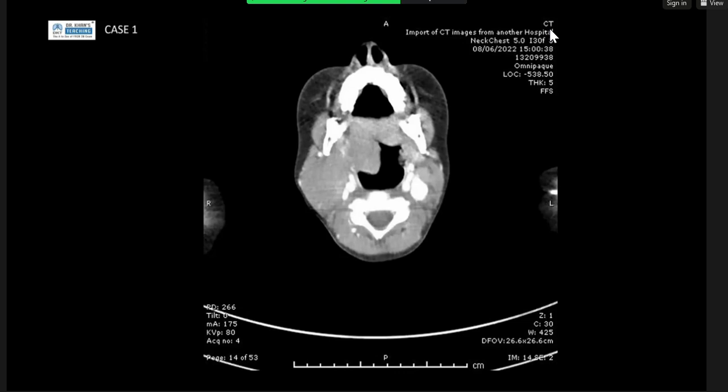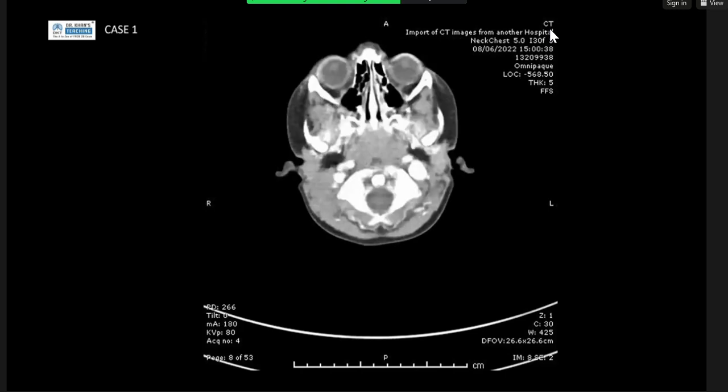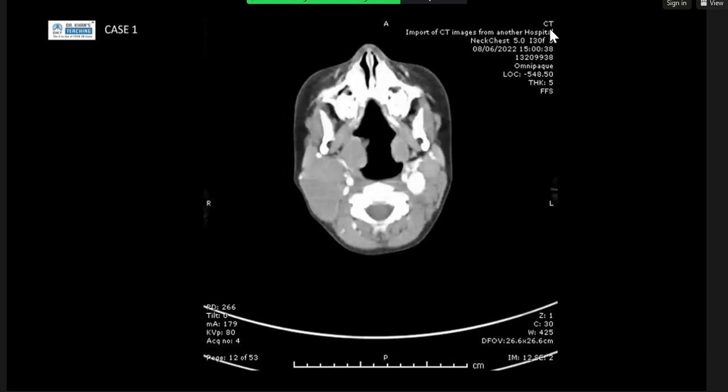Well, this is a CT study of. Just once again, I'm going to scroll because this is a slide deck. Okay. So I'm scrolling. Okay, and I'm going back. Okay.